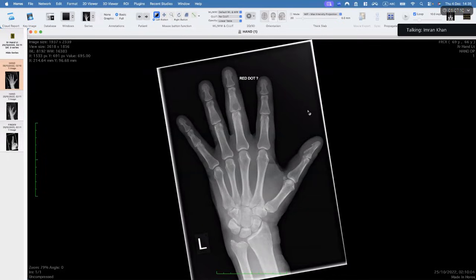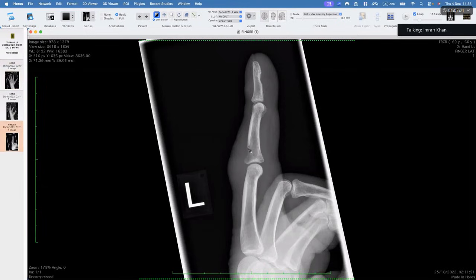But in this case, you felt very confident, but your confidence was completely off the chart, right? You were absolutely confident this is a chronic sort of pathology. This is anything but chronic. There is intramedullary signal change, there is periosteal reaction, there is scalloping of the bone, but the bone still looks very irregular.